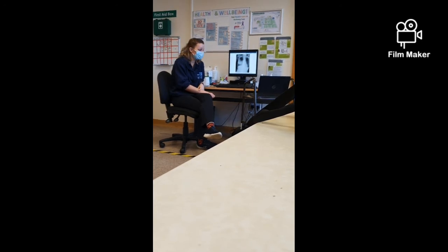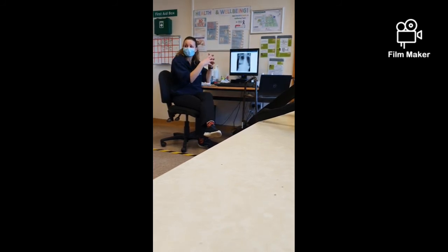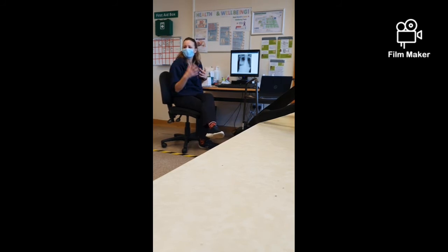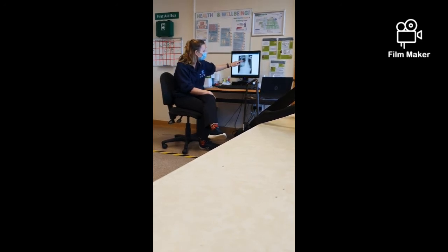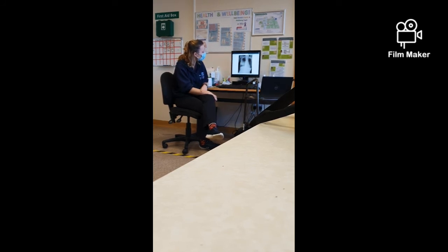Consolidation? Yeah, consolidation. So that's pneumonia, consolidation. The air's not getting into that specific zone. So that's a mid zone, isn't it, on the right? Again, as you were discussing from a collapse point of view, this zone, it's not collapse, it's mid zone, but there's consolidation there. But we are still getting air up, and we are still getting a bit of air down there. Okay. So then cardiac, let's just have a quick look at the cardiac.